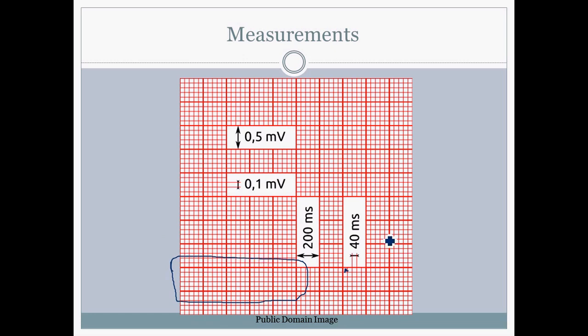The 300 method, which I'm going to look up just to be sure I remember exactly how that works. Okay, for regular rhythms, you can use the 300 method. That's where you measure the distance between 2 R waves, so the highest peak on lead 2.